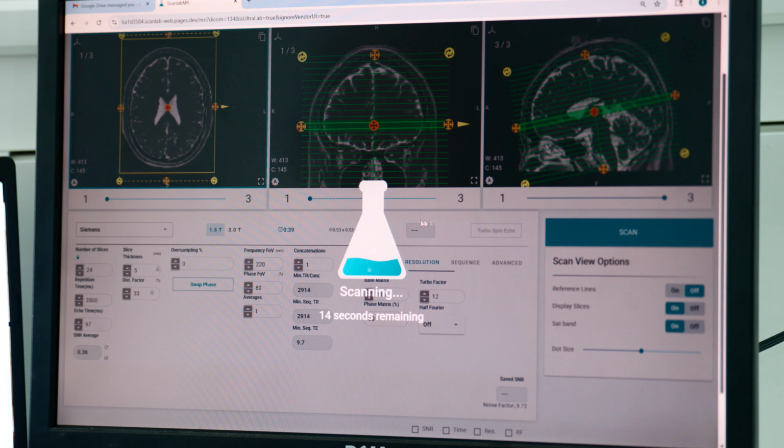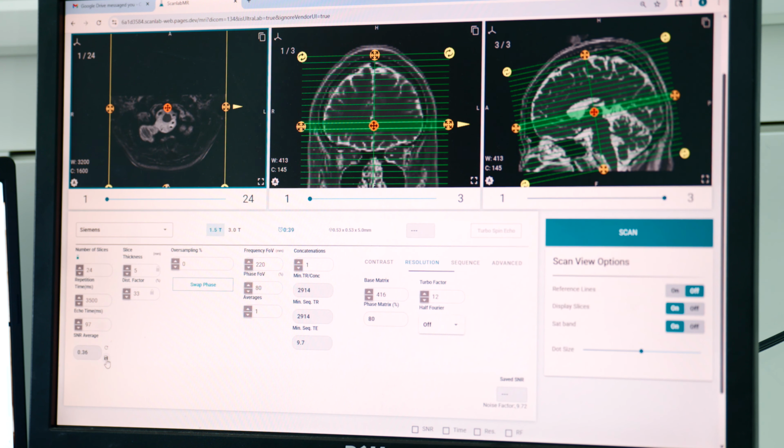A lot of us don't get the option to be able to change anything first of all, but we're always overly dependent on a protocol, and we're overly dependent on this number that you're going to see pop up here in a second, which is, as soon as I save this, our relative SNR calculator. So this is what you're used to seeing. I'm just saying that you're not given the whole picture. But for us, you actually are.